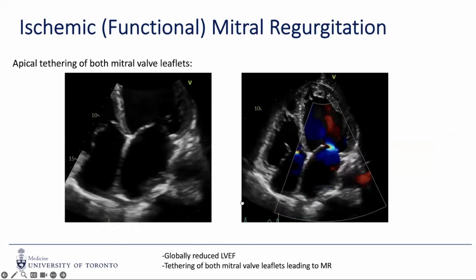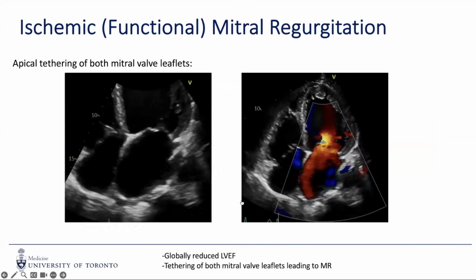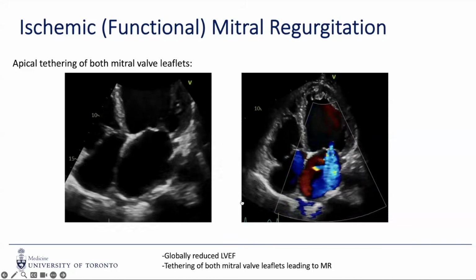Just some more pictures of the same. You can appreciate that nice jet of MR going more centrally, still a bit more posteriorly, but nevertheless definitely more central compared to the previous echoes showing the posterior leaflet.